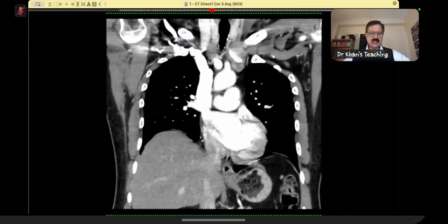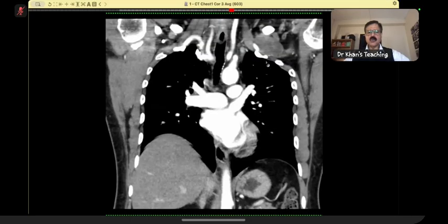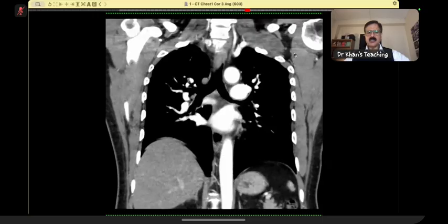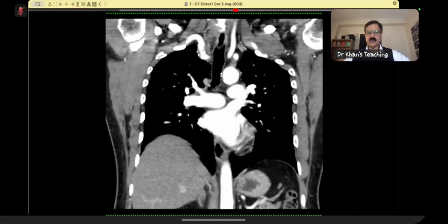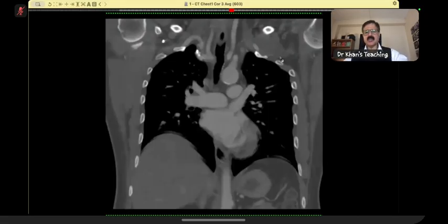Now, even on this CT scan, you had actually clinched your diagnosis. You did very well, and this is an elliptical shape. You can convince yourself that from there a nerve is going distal to it. It is elliptical in shape. You did very well when you picked up scalloping. So there was a bit of scalloping.